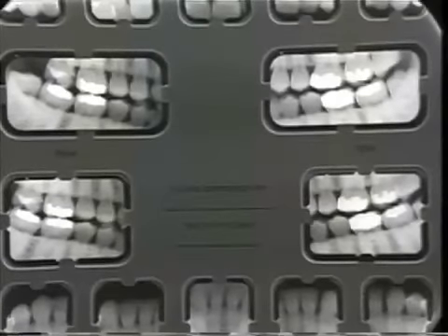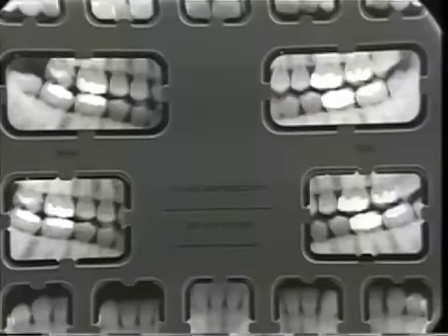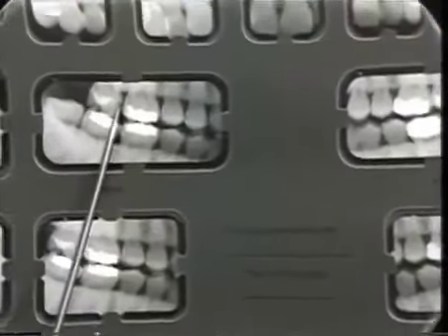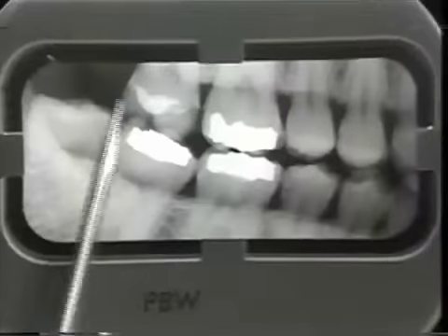After we have completed filling out this form number 3D, we will look at number 9A, 9B, and begin to fill out this form in the posterior bite wing column. And in the posterior bite wings, we will begin with tooth number 2. We know that there's some loss of tooth structure on numbers 1, 5, and 2, surfaces 1, 5, and 2 on this tooth.